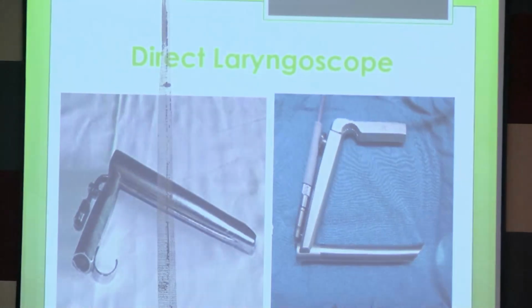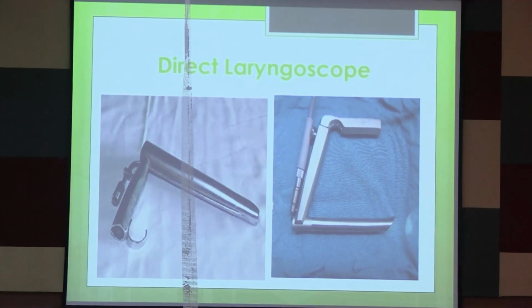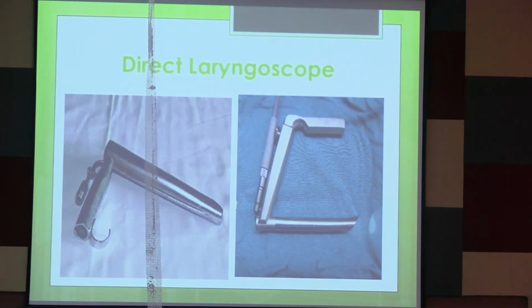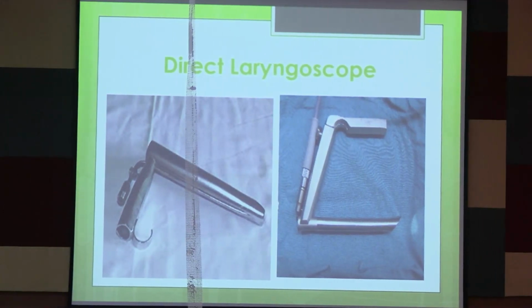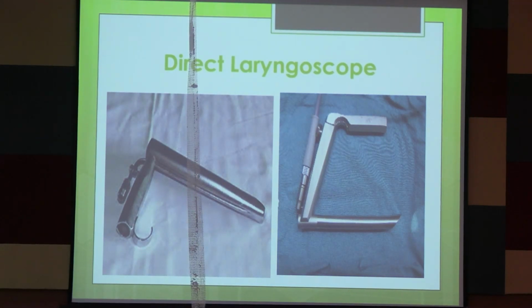This is a laryngoscope, yes? Generally it is given in postgraduation, still you have an idea. Okay? Direct laryngoscope, suspension laryngoscope we call it. Okay? We use this instrument to do microlaryngeal surgery. Okay? It also has variants, just see this. In anesthesia you have seen the Macintosh laryngoscope, okay? That is an anesthetic laryngoscope. This is different, okay?